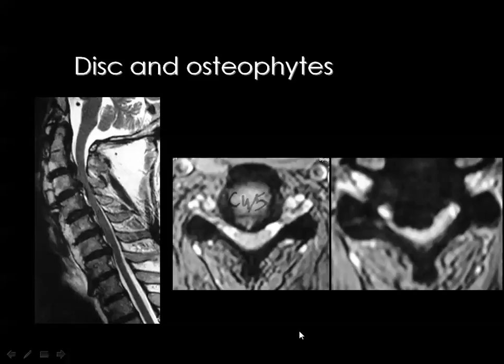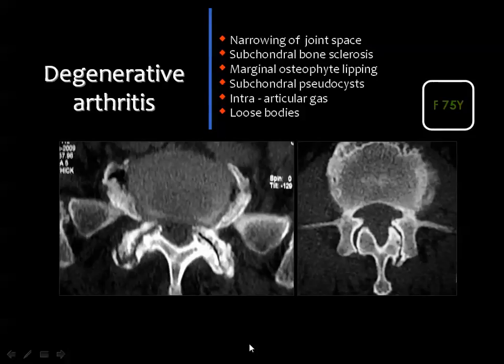Actually, this terminology is no longer used, but we can safely say that this disc is associated with a traction osteophyte, and we should include this in the report for the surgeon to be ready to remove the disc as well as the osteophyte. Anterior osteophytes are of little significance, posterior osteophytes are more important.